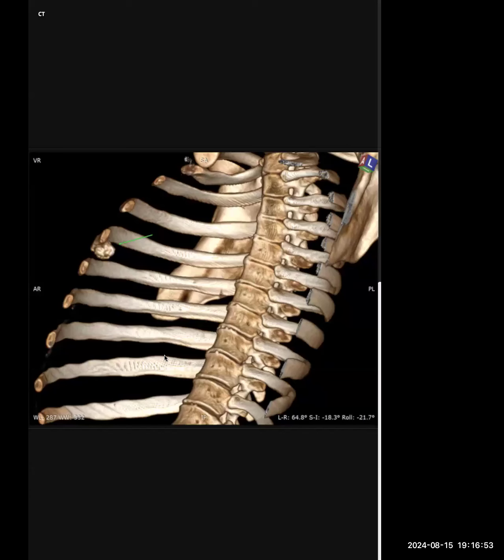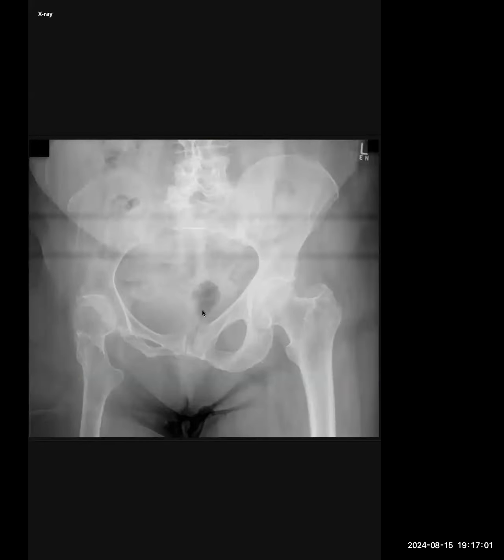So this was good. I would give you a 5.5 on the X-ray, but a 6.5 on the CT, because you got the CT right away. This one, very well done. 7.5 from me. Nothing much to add.